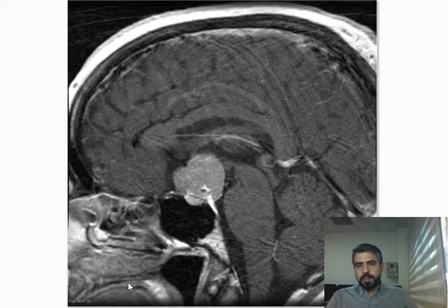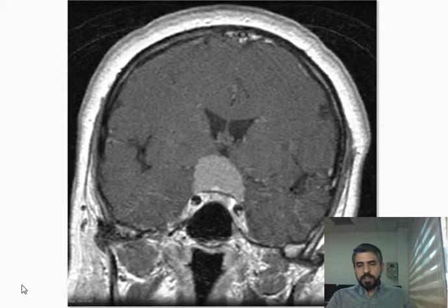This is the same kind of tumor. It's a meningioma. However, it's not in the clivus. It's a suprasellar meningioma arising from the meninges here in the suprasellar compartment and extending upward, showing dense post-contrast enhancement on this sagittal T1 weighted image with contrast. This is the same patient with the coronal image. You can see it's in the sellar meninges and extends upward.